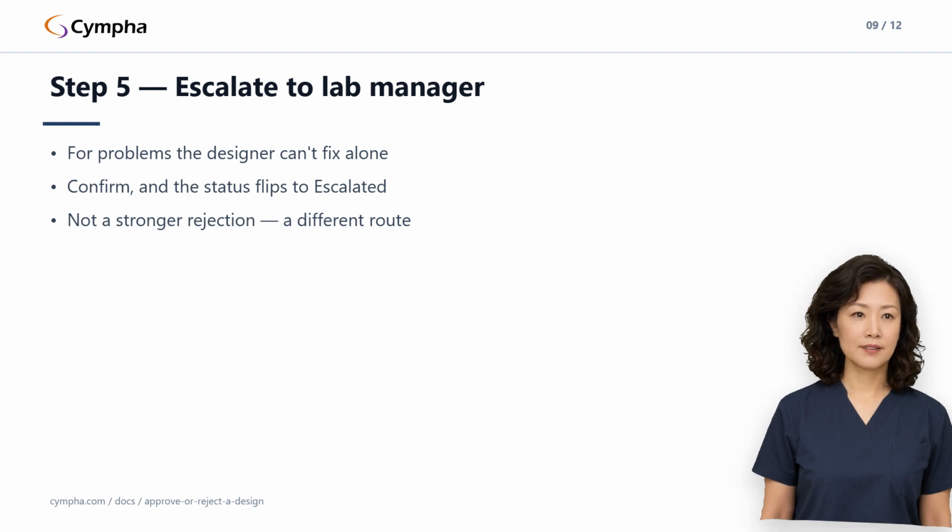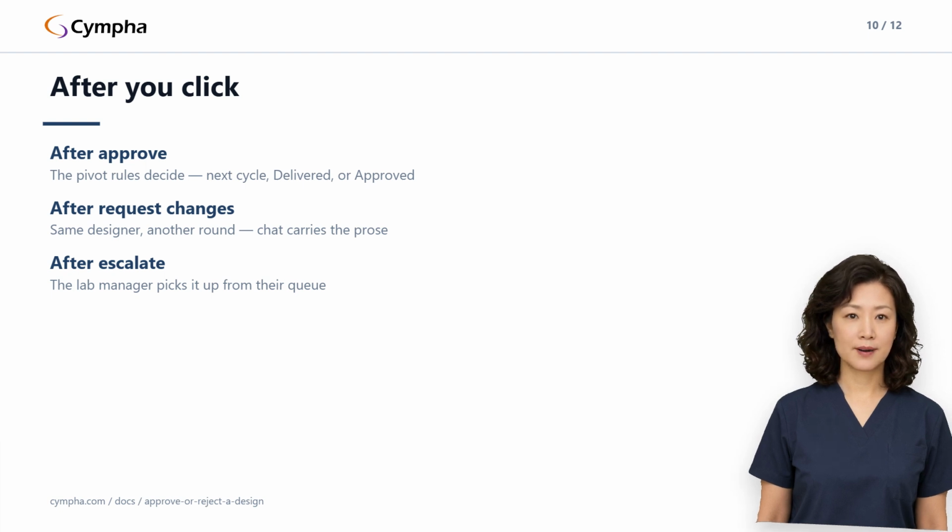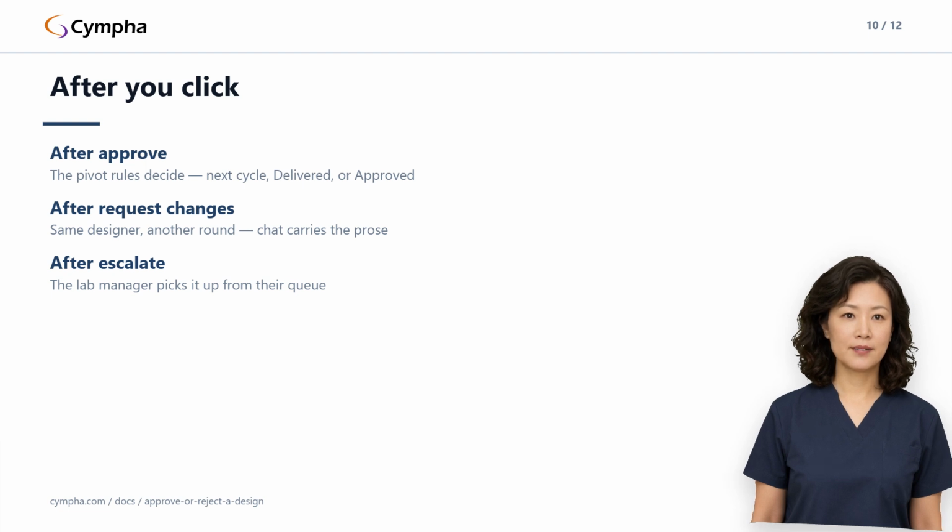A quick map of the aftermath, whichever button you pressed. After Approve, the pivot rules from Step 3 take over. Back to designing if a cycle remains, straight to delivered on the final cycle of a digital case, or resting at approved on a lab service case until manufacturing starts. After Request Changes, a success toast confirms the case is back with the designer who built the deliverable. Put your context in the chat, and know that the activity log records the rejection event, so the history is permanent. After Escalate, a success toast confirms it, and the Lab Manager picks the case up from their queue. In every branch, your dashboard row updates to match, so you can watch the consequence of your click from the same place you started.